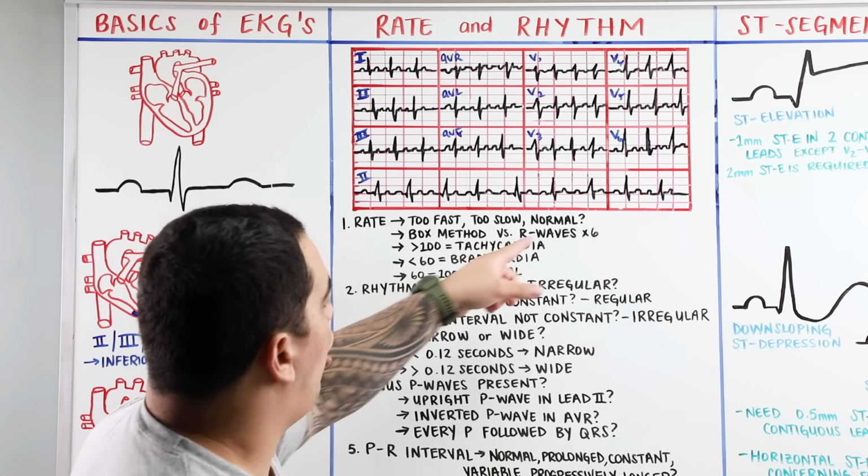The next one here is, what if I'm going too fast, with an irregular rhythm and a wide QRS? Polymorphic VTAC, there are 2 types, normal QT and prolonged QT. Atrial fibrillation with Wolff-Parkinson-White syndrome, that's a pretty serious one, and AFib with a bundle branch block.